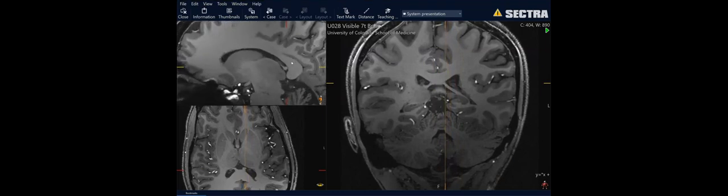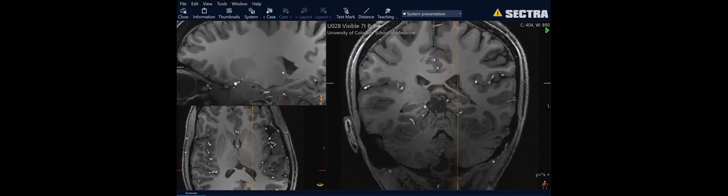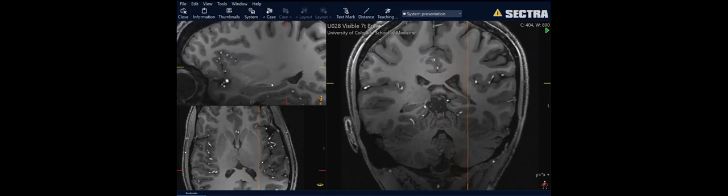But what we can also see is the head of the caudate, body of the caudate, moving laterally, and it's very thin at this point, but found superior to that inferior horn. And this is illustrating that point about the hippocampus as well. Here we have the cavity of the inferior horn of the lateral ventricle, hippocampus inferior to it, and the amygdala superior and more anterior.